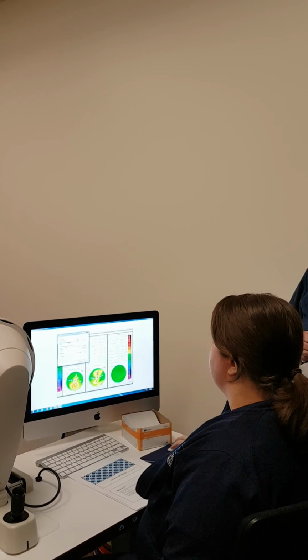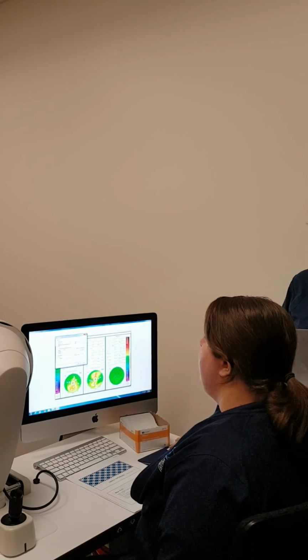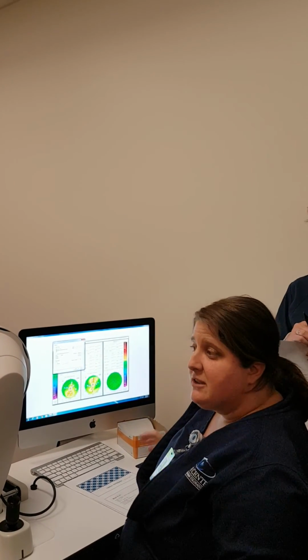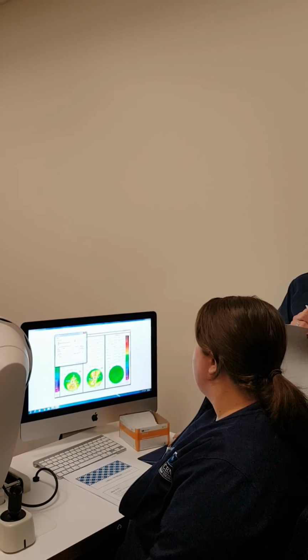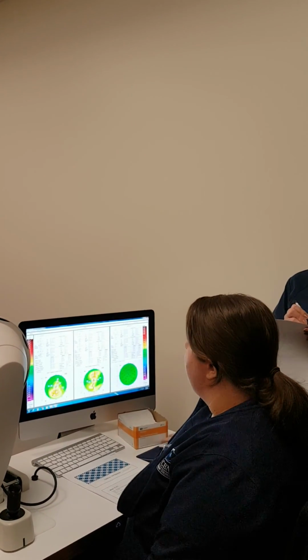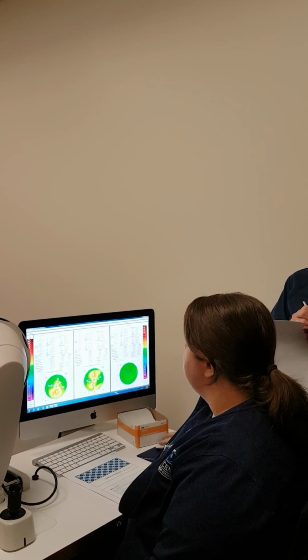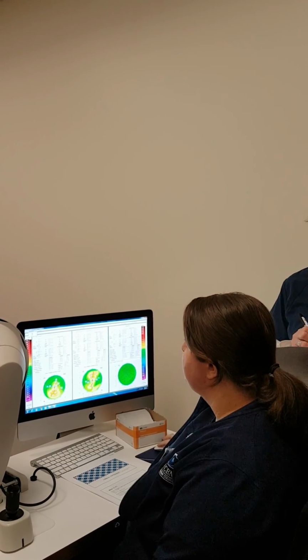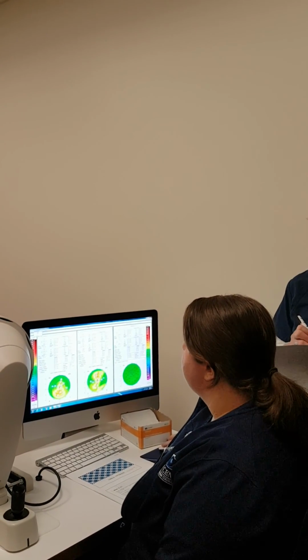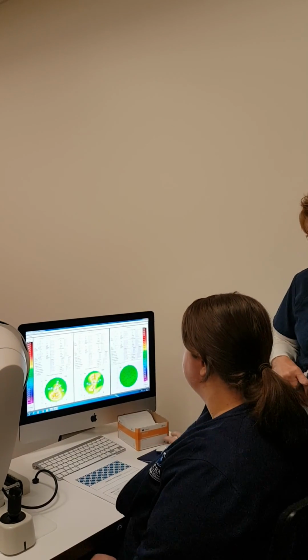Should we add this to our protocol for keratoconus follow-ups? Yeah, it might be helpful. Dr. Mayer will often just pop over here and take a look at it and print it himself because nobody knew how to do it. But yeah, if we wanted to add it to protocol after going over this, that would be fabulous because it does help him a lot. So that is the progression analysis for the Pentacam. Let me go back to today's.